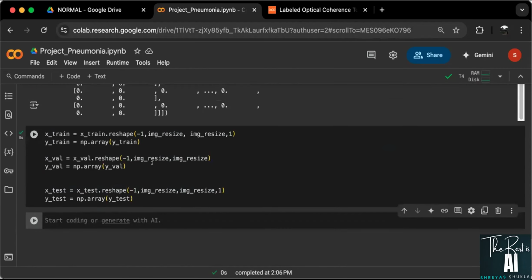Now there you go. You have your X train, Y train, X validation, Y validation, X test, and Y test ready for you.